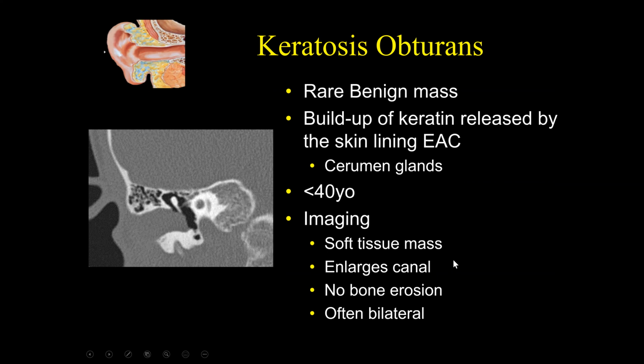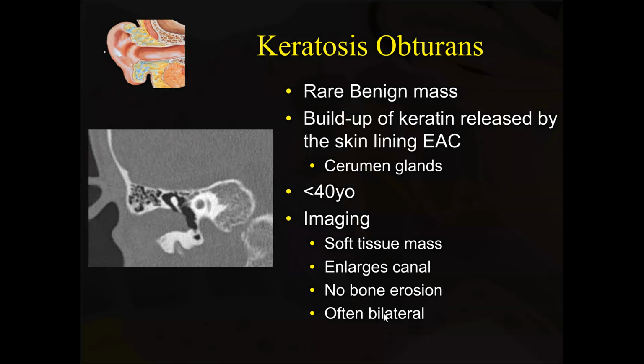auditory canal. So when we look at the imaging findings, it's typically a soft tissue mass. In advanced cases, it can enlarge the canal, with no frank bone erosion, typically this sort of expansion and regressive remodeling, and it's oftentimes bilateral.